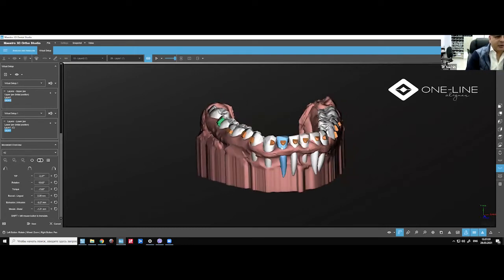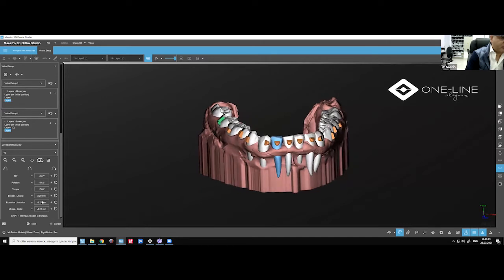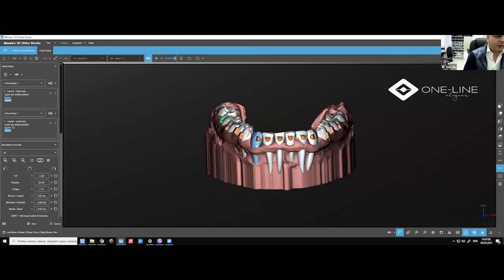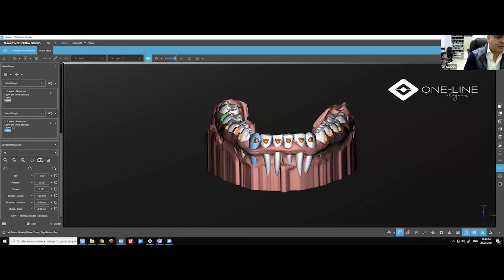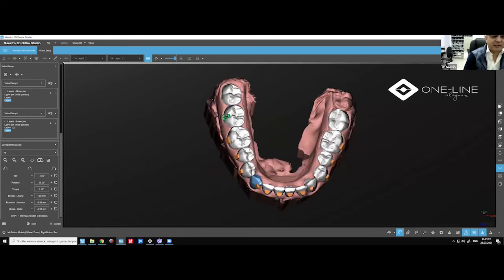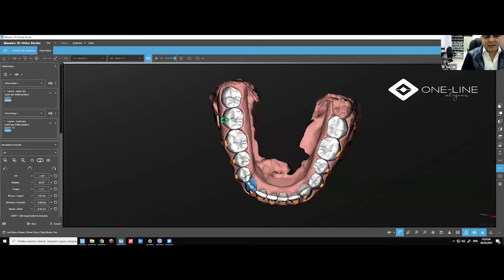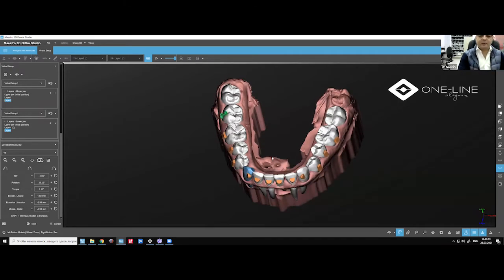So we have almost all the front teeth. We have almost -3 of intrusion, -3 and -3 everywhere. And then we have on the canines as well around -3 of intrusion. But we do have also a big rotation on the canine, 26 degrees of rotation on the canines. So that's why we have an attachment on the mesial side with the force going towards the mesial side. We can also add a distal lingual attachment on the canine. I think we will just see with time, and if not, then we'll do some changes with the pliers on the canine if needed with time.